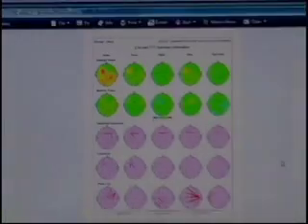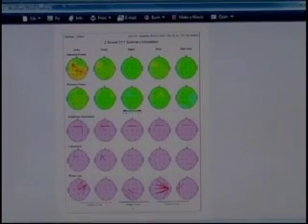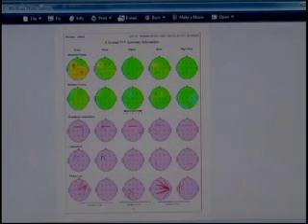I'll double click on it. There's the summary, saved as a bitmap graphics file. And there I see my absolute powers, relative power, amplitude asymmetry, coherence, and phase lag, all on a one-page report, which is very convenient to send out.